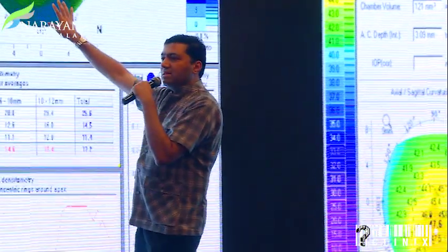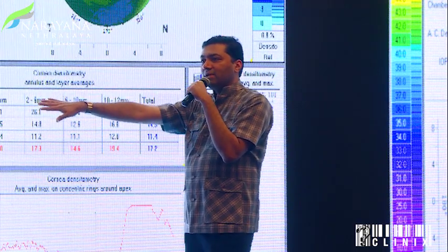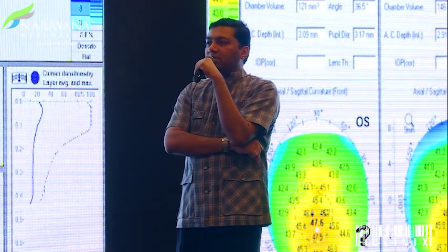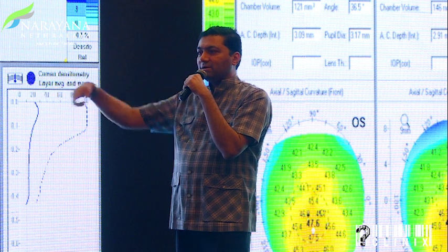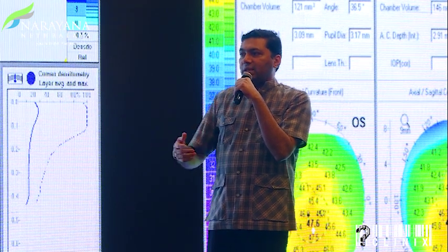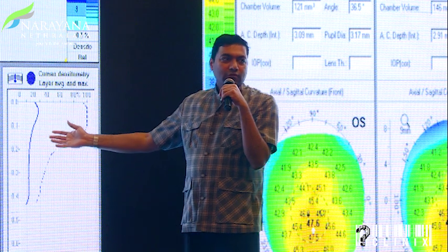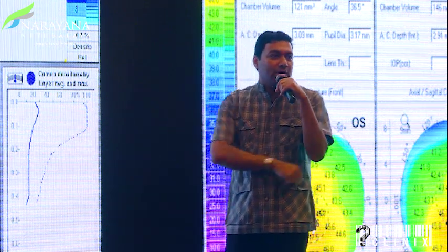But how do you? OCT is a great tool, but this is again for a lot of us who want some value to be seen, some colors to be seen. In fact, with OCT, if you sit with somebody and develop math software, you can actually get much better things like this, because it's more of a clinical picture. But if you don't have OCT, and if you have just a Pentacam, I think this is definitely a tool a lot of cross-linking people should be doing when you judge your outcome, good, bad, or ugly.